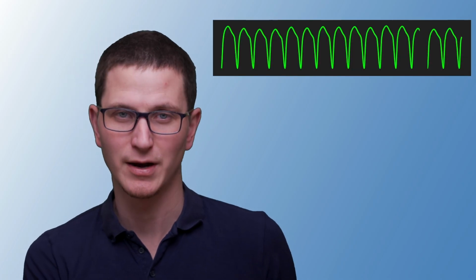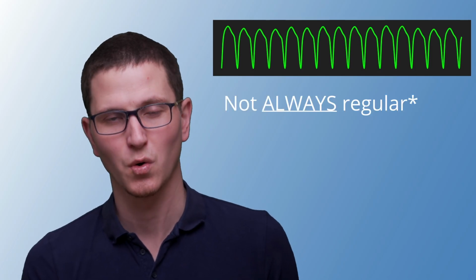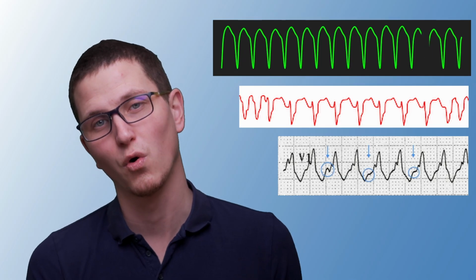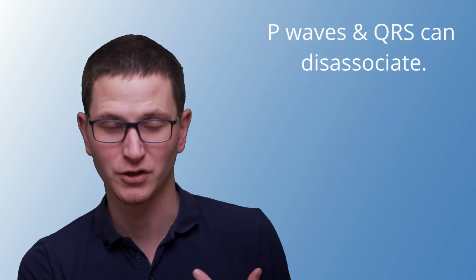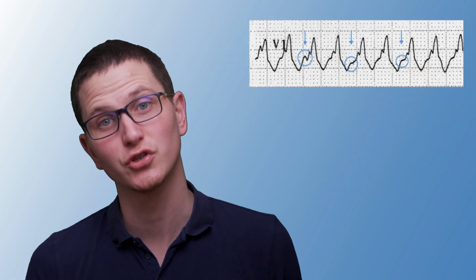How do we recognize VT, right? VT, ventricular tachycardia, is any rhythm that has a really broad QRS, and if it is regular, right? Rhythms can look quite varied. You can have different rhythms like these, and these would all be VT. There's a good chance that the atria or the SA node is lost within all this ventricular movement, and so all you're seeing is these ventricles, right? It often looks like a shark tooth. And that's just a very broad QRS.